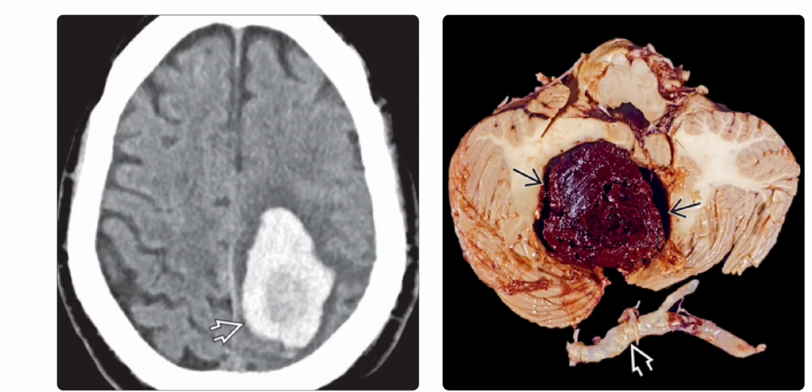Left image is the axial CT scan in a 73-year-old male, and it shows an acute frontal and parietal lobe hemorrhage. MRI showed underlying enhancement, and biopsy disclosed metastatic disease related to melanoma.